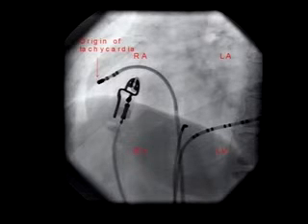Why I'm showing this is that if the atrial tachycardia originates high in the right atrium, like it is here, high in the right atrium, the P wave will look like a normal P wave, because the sinus node and the tachycardia focus both are not very far from each other. Next slide.